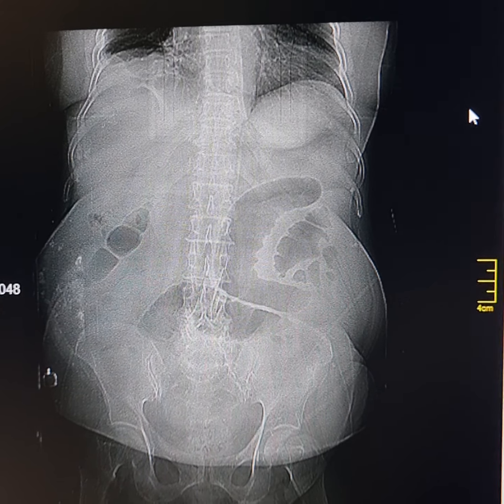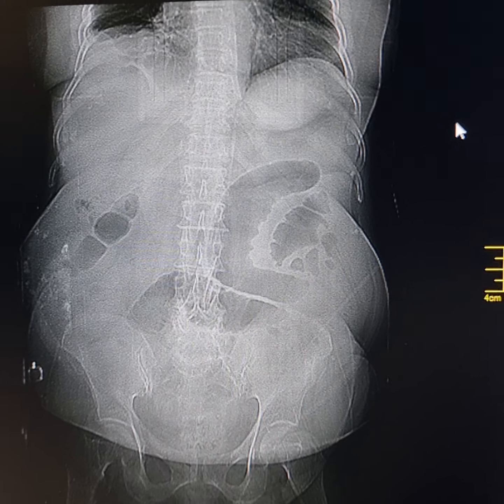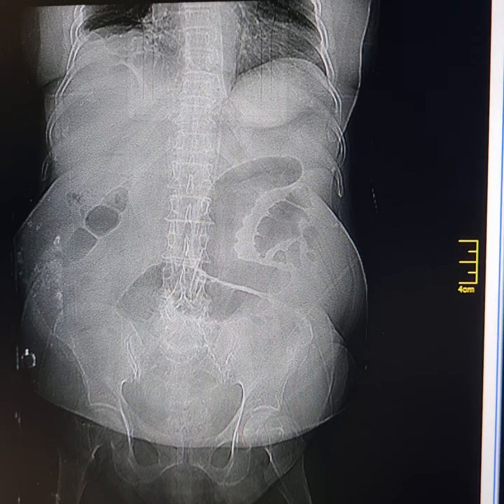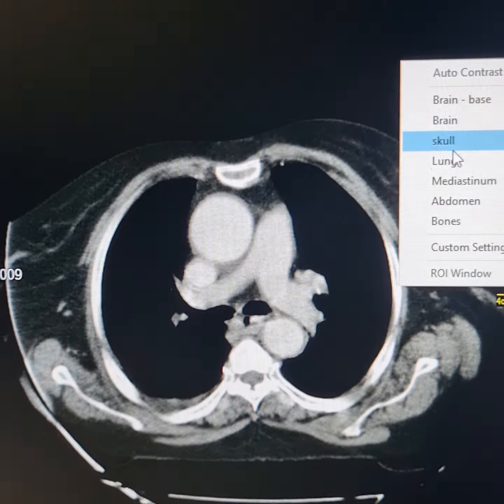Scanogram of CT abdomen of a 72-year-old female patient. Please observe angry-looking small gut segments here. This one is slightly dilated. Now I will show you her CT scan.